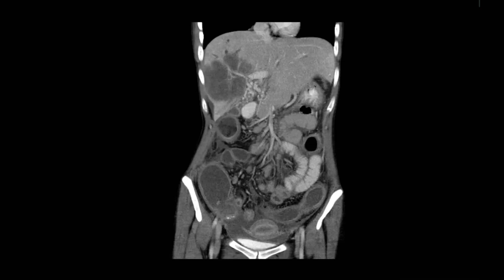So the next step would be ERCP. Why ERCP? Sir, on ERCP, we can see if there is cholangiocarcinoma or sclerosing cholangitis. No, the patient has biliary dilatation. So no, this is a patient with ulcerative colitis with sclerosing cholangitis.